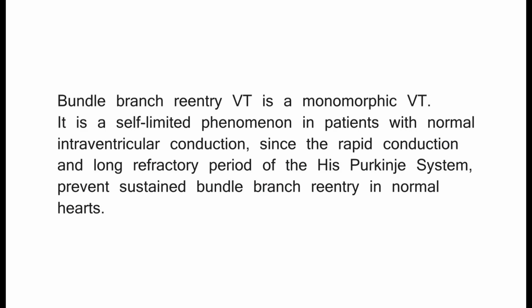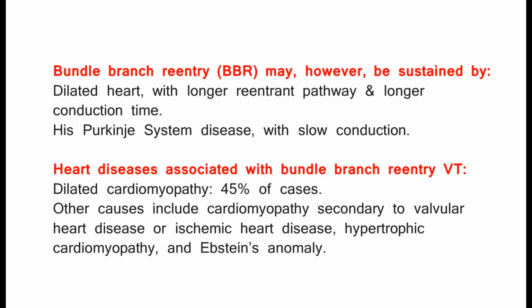It is a self-limited phenomenon in patients with normal intraventricular conduction, since the rapid conduction and long refractory period of the His-Purkinje system prevent sustained bundle branch reentry in normal hearts. Bundle branch reentry, BBR, may, however, be sustained by dilated heart, with longer reentrant pathway and longer conduction time, and His-Purkinje system disease, with slow conduction. Heart diseases associated with bundle branch reentry VT: dilated cardiomyopathy, 45% of cases.